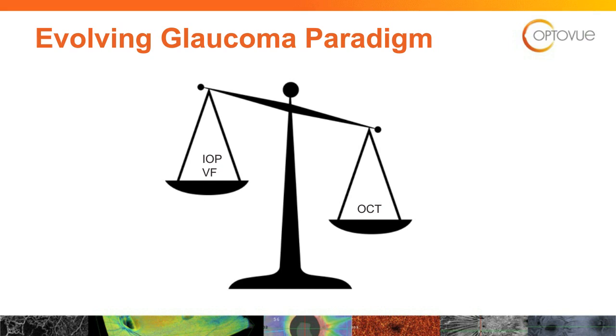And while we don't want to diminish the utilization of optic nerve head photographs, I think OCT, because of its reliability, its reproducibility, and its objective way of assessing the nerve fiber layer and ganglion cell complex, is really becoming a mainstay in glaucoma care these days.